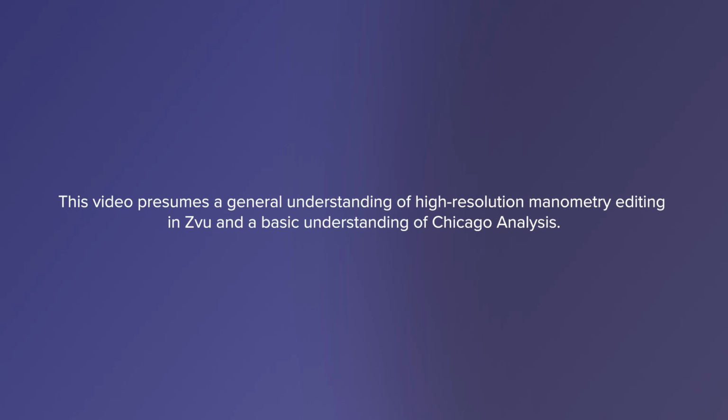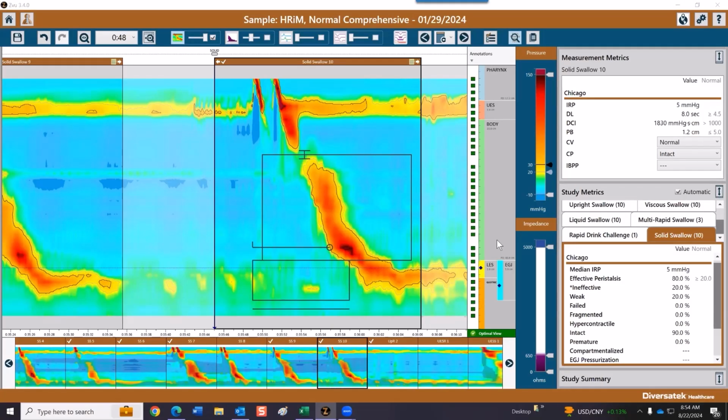Welcome to the focused video that will cover the edits of solid swallows and solid meal swallows. These provocative tests give a greater challenge to the esophagus, which may bring on symptoms, and give additional supportive information to the interpreting physician.